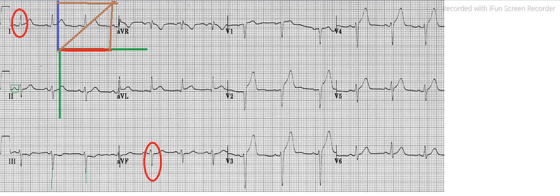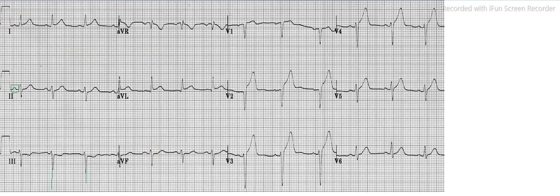Now we have already discussed the P wave, which is normal, and there is no AV conduction delay because the PR interval is also almost equal. But you see here certain distinct morphologic changes you can find. Let me erase them all. So you see here, similarly in the same pattern you can see here, similarly another here and here. So you see here a distinct change that you will be finding.